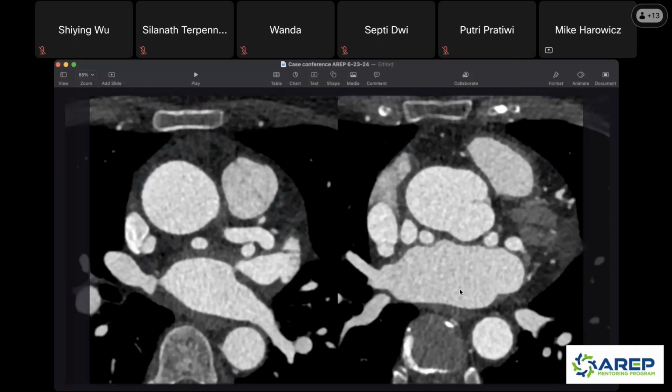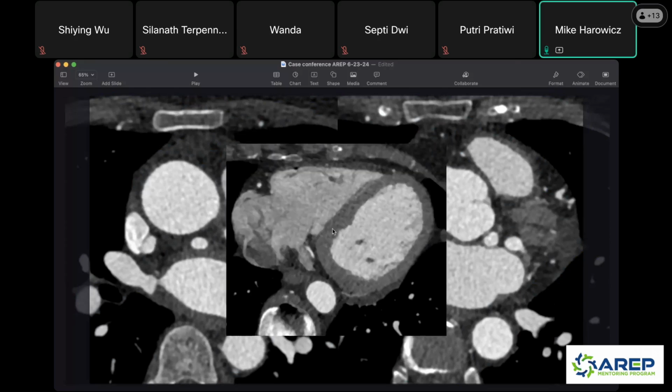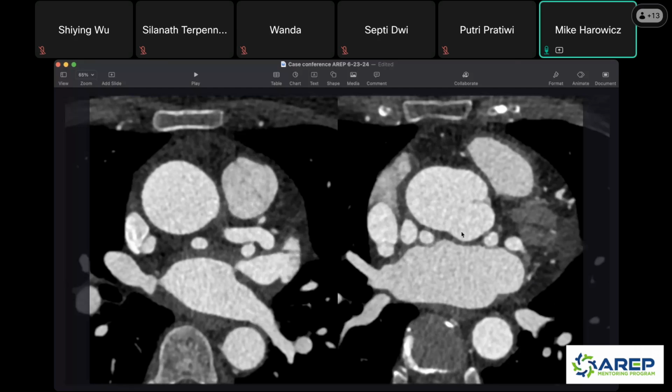All right, so what catches my eye first is that this is your left main, getting into your circumflex and your LAD. It's very big, right? So to show sort of a comparison, you scroll lower down and this is the same patient, same exam. This vessel right here, between your right atrium and your right ventricle, is your right coronary artery. And this is your distal LAD. These are normal sized vessels. This is what I expect, couple millimeters big. These vessels that I'm seeing here are ginormous in comparison.